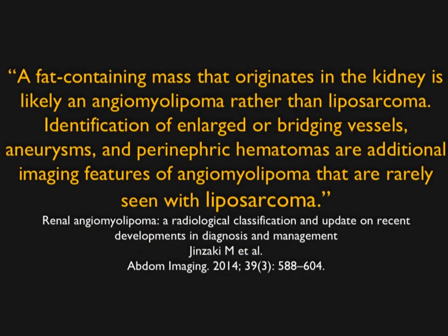There is a question, what about a liposarcoma? I think I showed cases of myelolipomas of the adrenal, and sometimes it's a very large retroperitoneal lesion, and could you confuse it with a liposarcoma? Occasionally it can, but confusing AML of the kidney with liposarcoma is more a theoretical process, and it's typically not going to be really that much of a problem.